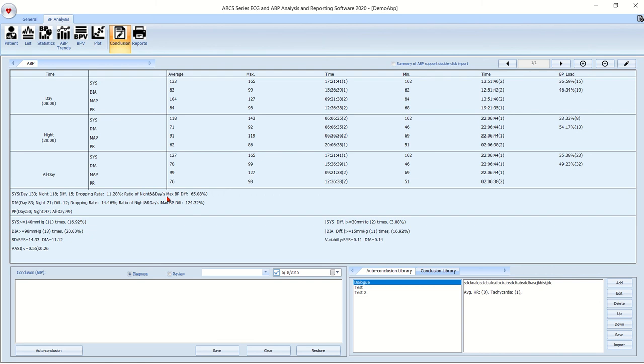Welcome back to the ARCS2020 Ambulatory Blood Pressure Monitoring Software Review. In this fourth and final video, we will review the conclusion and the report section or icons. In the first one, we're in the conclusion section now.